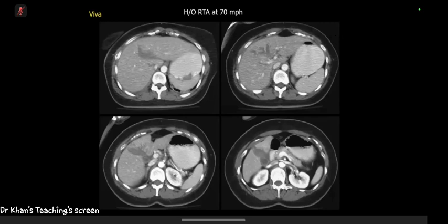So these are selected contrast enhanced axial images of the upper abdomen for an adult patient. There's multiple hypodense linear areas throughout the liver, most likely in keeping with acute liver lacerations. I can't see any active extravasation of contrast on these images. But there is an impression of some free fluid around the liver.